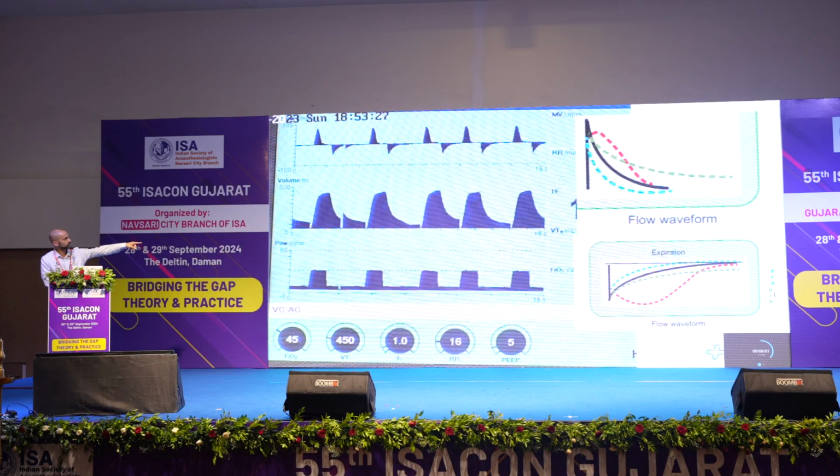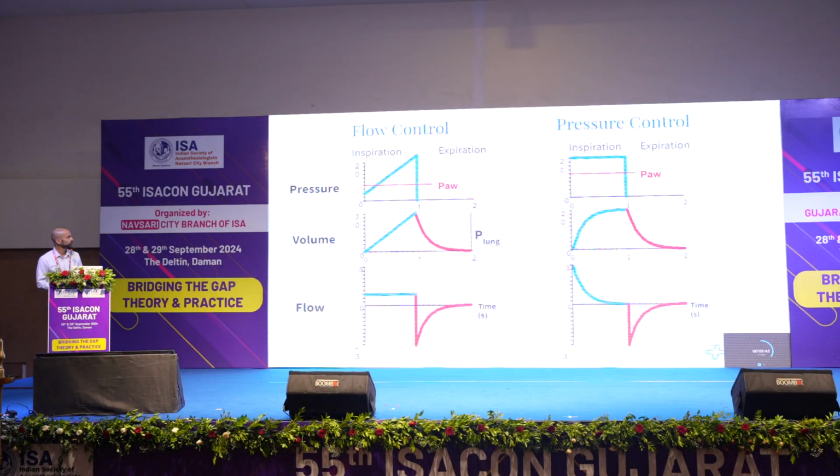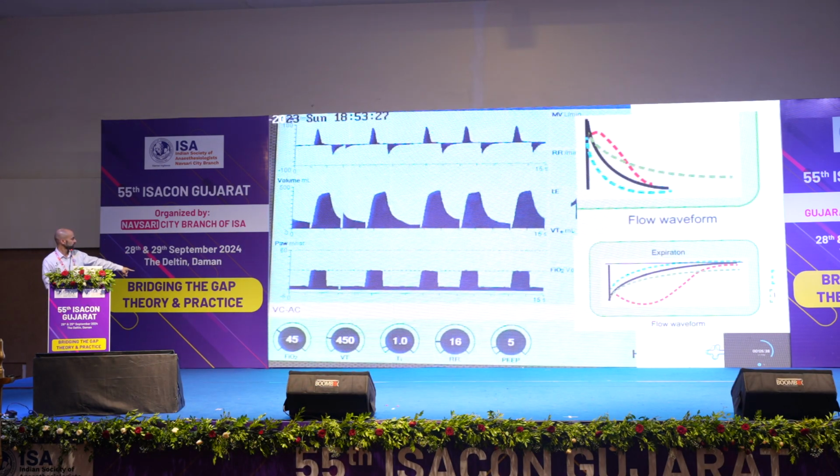So the pattern that best fits is the blue dotted line. This is an elastic load. Low compliance, high elastance. This is an elastic load. Again, train yourself. In pressure control, when you see a rapid decline in flow, reaching baseline quickly, a very short time constant, that's a compliance problem. So remember I told you how manufacturers can trick you. See the mode name here? It says volume control. This is not volume control. Absolutely not volume control.